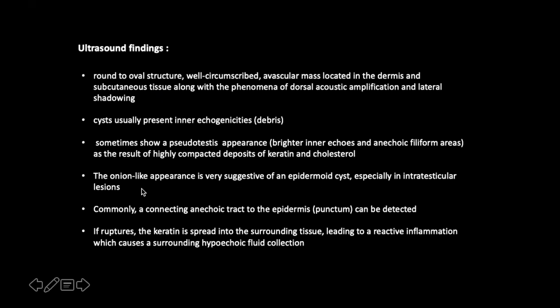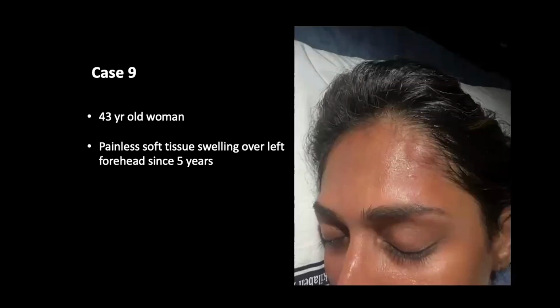So ultrasound is sufficient. It is spotted in many cases: a well circumscribed avascular mass in the subcutaneous tissue plane, with a linear filiform pattern, this onion-like appearance, pseudotestis appearance, and a punctum draining it. So we don't need any further modality, and ultrasound is sufficient.